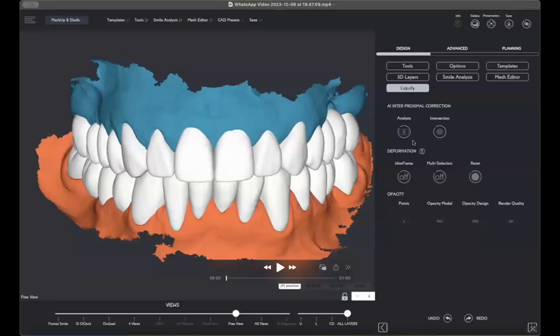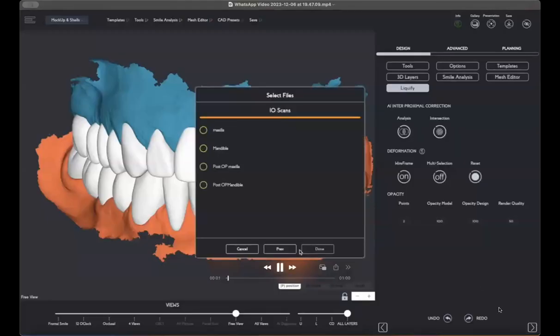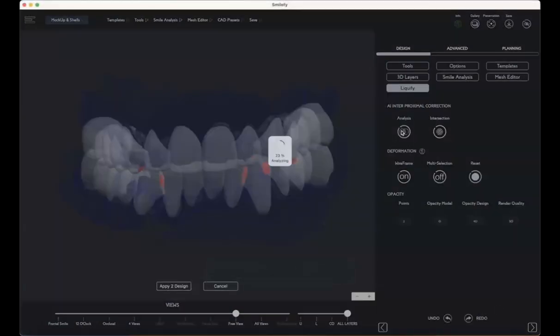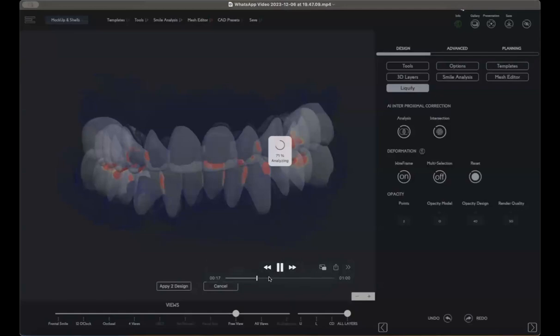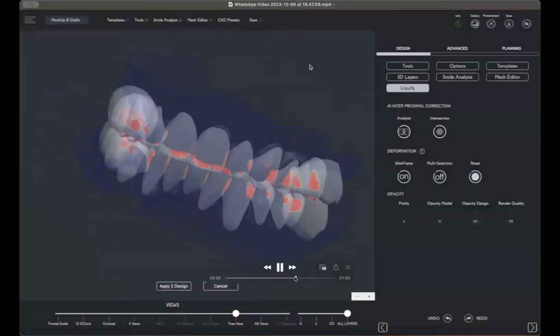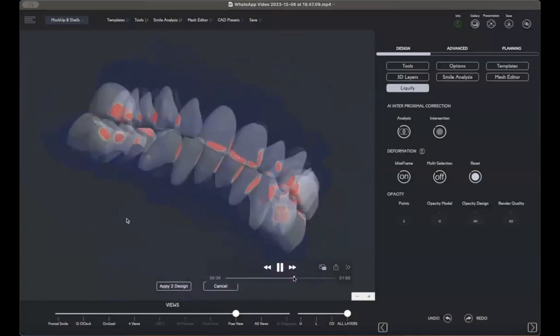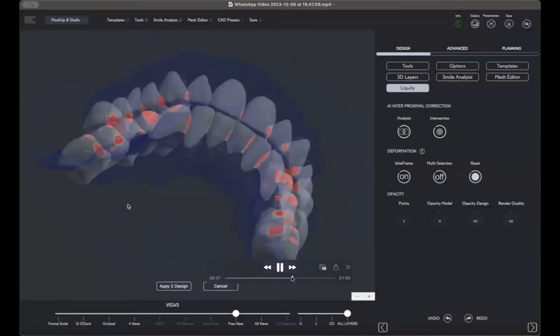And then of course in Liquify we do have the very important option to check interproximal spaces and check the function and the contact points. As you can see here, click on a button, we check and we analyze everything, and then it's one minute. That's fine. So now in our design, we have all the contacts and the interproximal spaces.